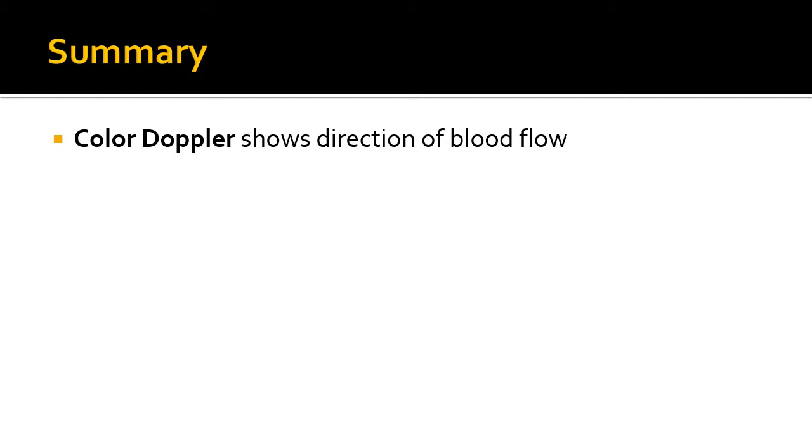In conclusion, color Doppler shows us the direction of blood flow only, not the type of blood. Use the acronym BART to keep the blood movement clear in your mind.